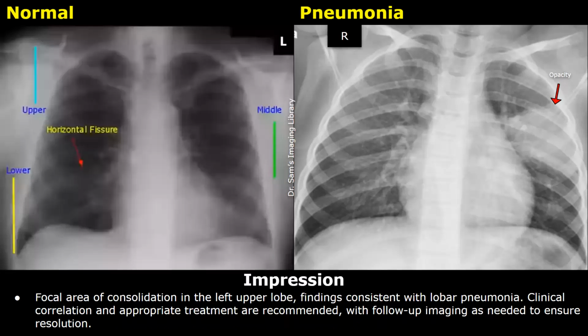This is the impression: focal area of consolidation in the left upper lobe, findings consistent with lobar pneumonia. Clinical correlation and appropriate treatment are recommended, with follow-up imaging as needed to ensure resolution.